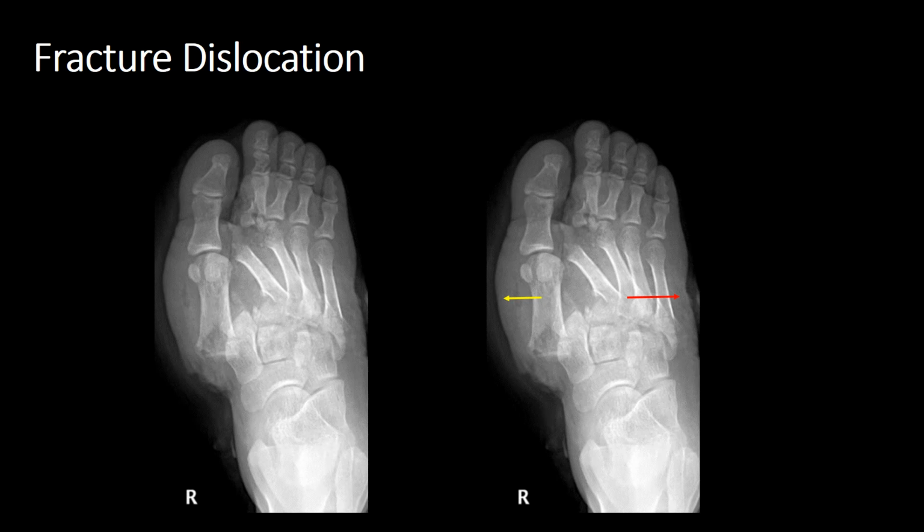This is a really complex injury. You can see there's a massive chunk missing out of the first metatarsal, there's chunks missing out of the second. This second metatarsal head has been completely obliterated. There are fractures through the phalanges, and if you look, fractures through the head of the third metatarsal and all through the bases of the fourth and fifth metatarsal. So it's a really complex image, and it would definitely require CT for further evaluation.